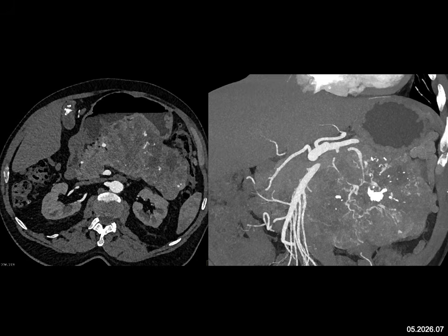Islet cell tumors can have dystrophic calcifications, but it's almost like too much infiltration for a neuroendocrine tumor, but it's a thought. It doesn't have the look of an adenocarcinoma. Adenocarcinomas do not calcify typically unless the patient had prior pancreatitis, and typically with adenocarcinoma you would see a dilated pancreatic duct. On the other hand, serous cystadenomas can be large. They can be aggressive looking.